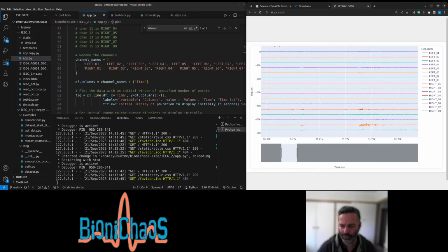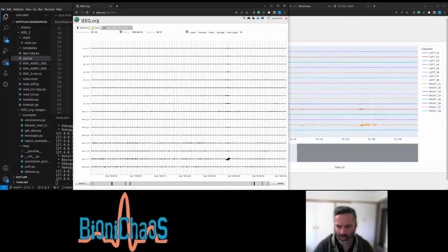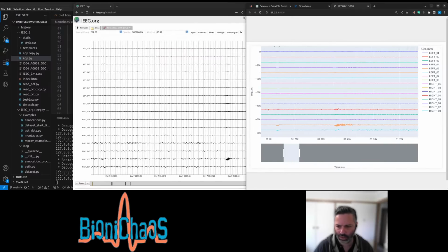Can double check with this artifacts as well, just quickly. Yeah, scrolling in this thing. Right, so that's there. We have another one here.